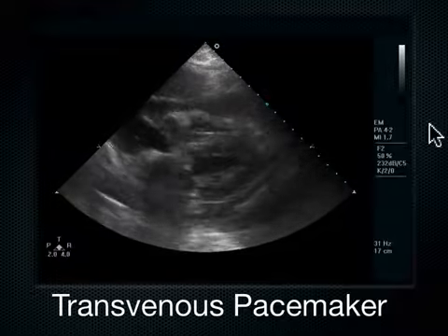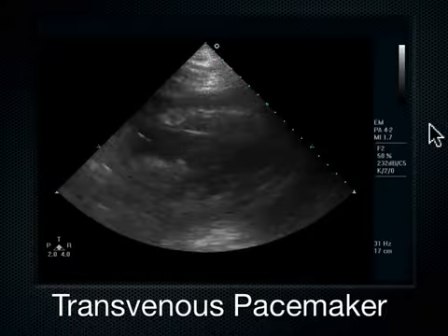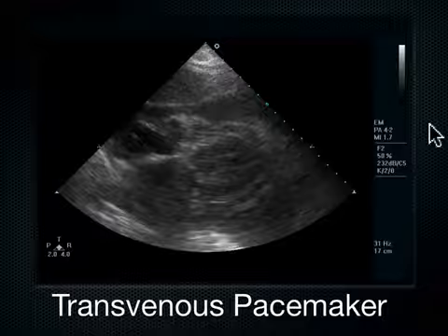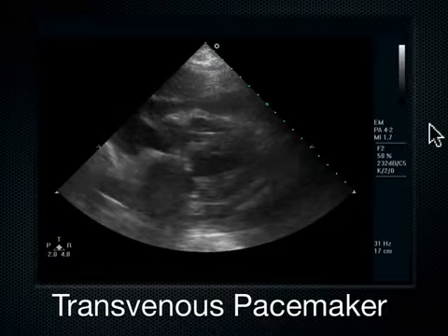It's just something to consider if you're in the heat of the battle and you're trying to float this transvenous pacemaker somewhere, wherever you are. Think about looking at it under ultrasound guidance so you can turn it and guide it to get it in that spot. Those pacing wires make very good reflectors of ultrasound.